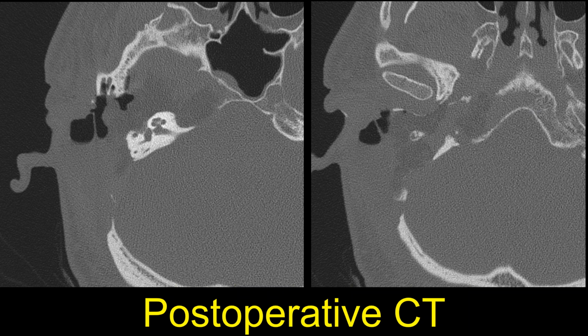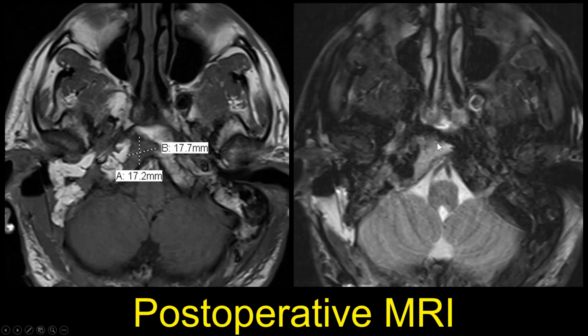But postoperatively, we image this patient, and just like in the cervical soft tissues, postoperative temporal bone cases can be very confusing. In this postoperative MRI, you can see the radiologist was measuring out this area. They saw this area and saw that it was bright on the T2 sequence, so they mistakenly thought that this was recurrence of the tumor at this level. You can see how they were measuring it.